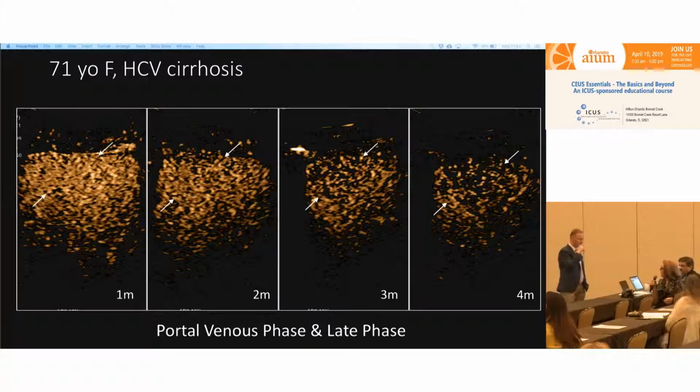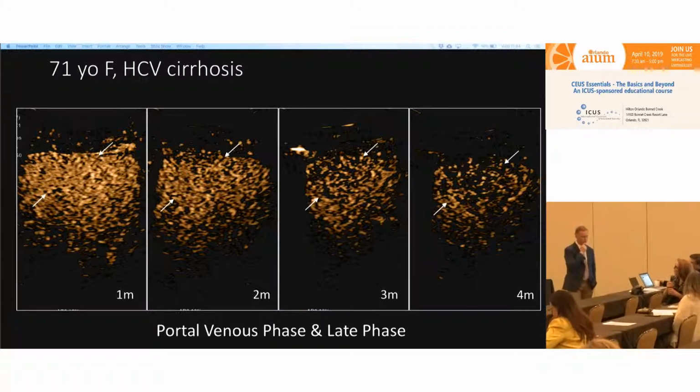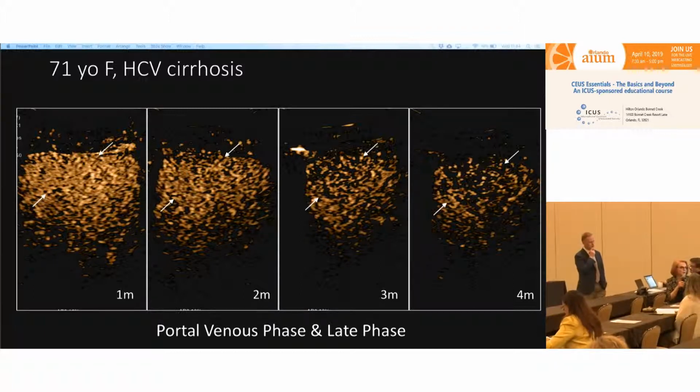So that's kind of a case where if you're not completely happy, then sometimes it's better to back off, and you always want to back down. If you weren't sure, let's say you didn't have that 3-minute picture and you just had the 4-minute one, well then I might back off one, always go to the less confident diagnosis. If you want to go to the more confident diagnosis, you have to be really confident. Agree.